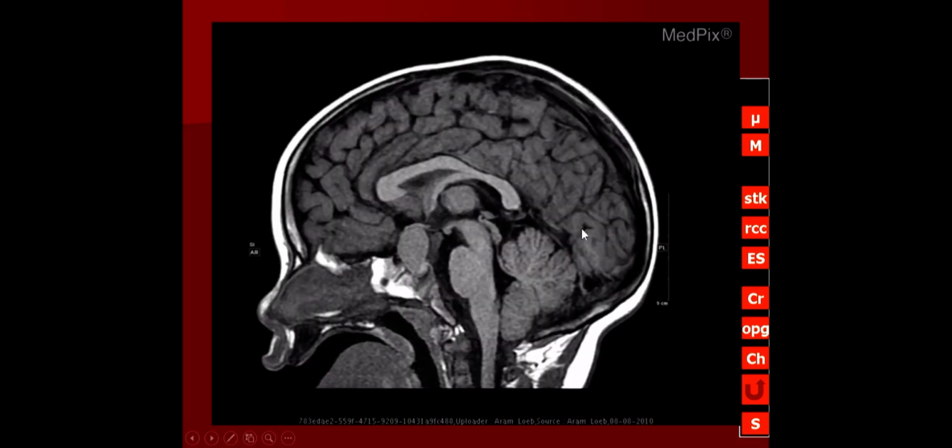The calcified rim is a little bit hypointense on the FLAIR. The lesion is clearly growing both above and into the pituitary fossa. And this is something that threw me off just a little bit when I first started thinking about it. When you have a pituitary adenoma, it starts inside the sella, but we saw a couple examples where the lesion was equally suprasellar and intrasellar. That can make it a little bit difficult to play who's your daddy, where did the tumor actually start?